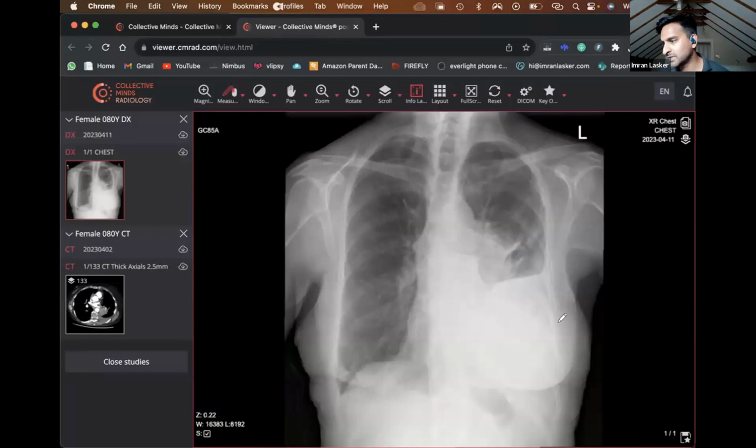And then we're going to be looking at the rest of the lungs, right? So there is a big abnormality here that hopefully people can see, and we can see that a few people have put a few answers already, which is really good. Thank you so much. If you do want to write any answers in the chat box, go for it, and I'll try and interact as well as I can while doing this live.